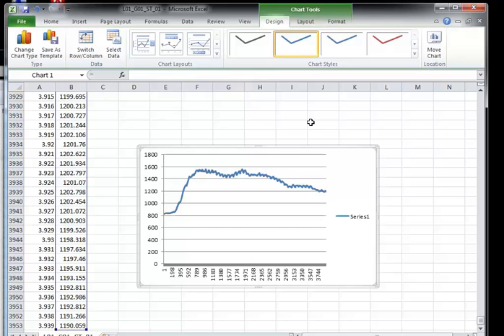So we really need to take a baseline and take that away from that force data, from the peak data, or else people who are heavier will appear to be producing more force than those that are lighter, and it wouldn't be a fair test. So we need to baseline that where it's necessary, which will be in most cases. Even if they have zeroed it, there may be 10 or 15 newtons either way out, so it's worth doing each time. So we're going to look at doing that now. So we need to check, find out what we're going to consider our baseline.